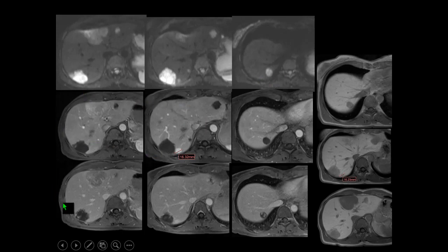The other one was a very slowly enhancing hemangioma. Then she had one hypervascular lesion here. In the hepatobiliary phase, hemangiomas do not uptake. This one takes up, especially in the periphery, so this was an FNH, and this was not. It was resected. It was an unspecified PEComa.